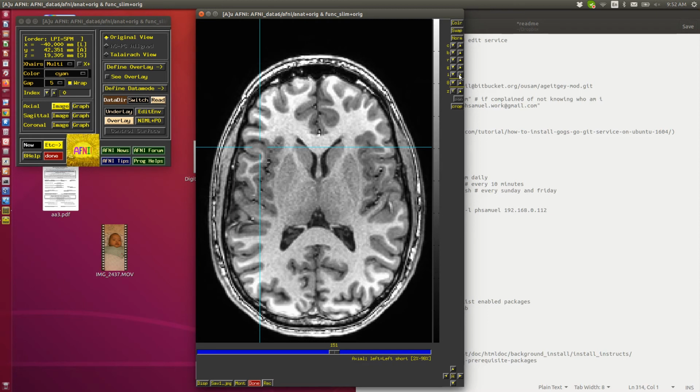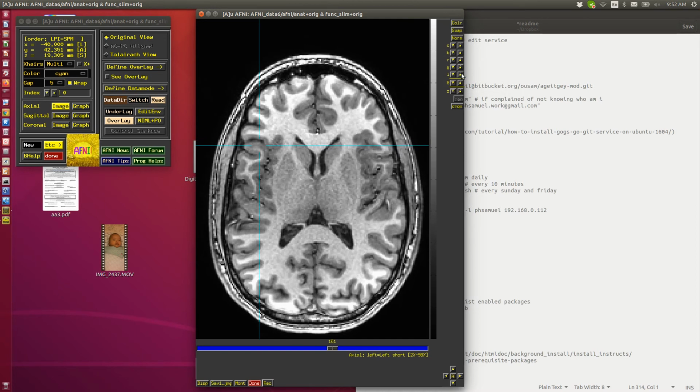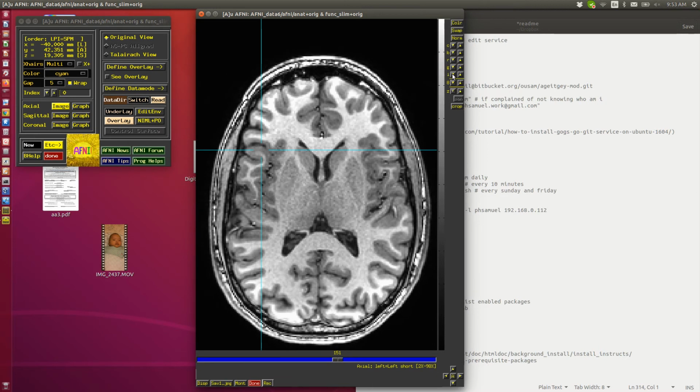What? I, which stands for image fraction. If you click I up, the fraction of the image in the window gets bigger. At one time, I tried to make this automatically adapt, and I failed because it would get into a war with the window manager. On some systems, you'd change the size of the interior image, and the window manager on the system would change the size of the whole window, and then it'd go back and forth into an infinite loop, which, well, if I had any hair, I'd pull it out. So anyway, you can adjust that as you please.